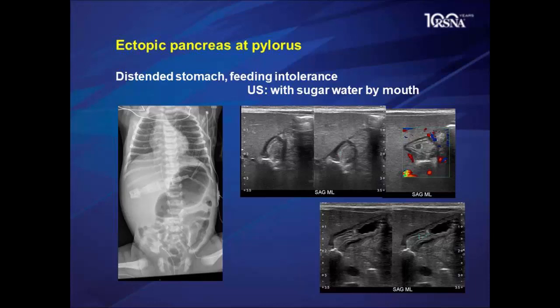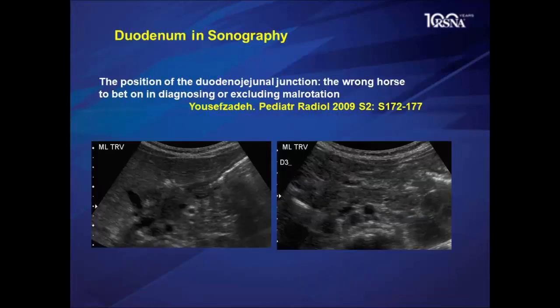We are more familiar with the ectopic pancreas causing bleeding, as in Meckel's diverticulum, where you have a mixture of pancreas and gastric tissue at that level. Now, since we are dealing with duodenum, one should be more familiar with the duodenum appearance on ultrasound. Here is an example of normal SMA-SMV on transverse view of the upper abdomen.